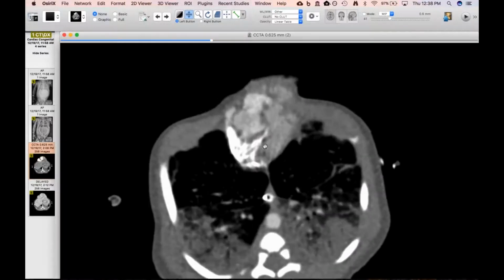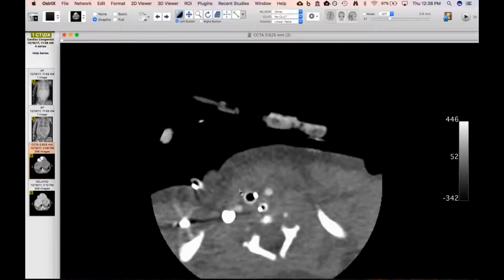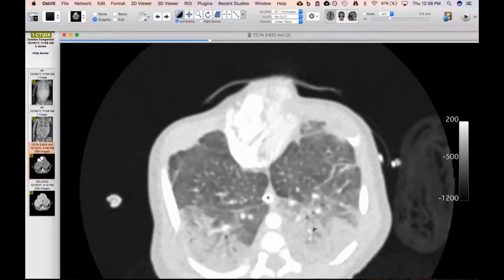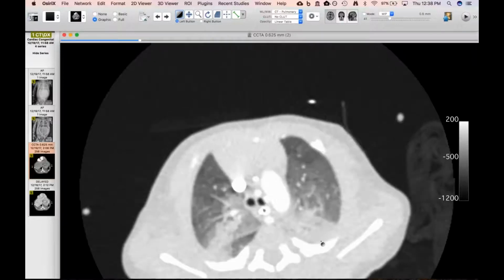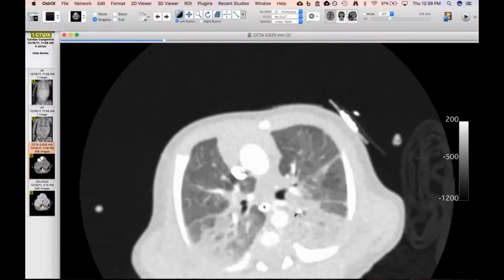So, were there any other anomalies outside the chest? The omphalocele, I don't know, and I actually looked. The airway branching pattern was normal. This is just shortly after birth, so I don't know if some of this is aspiration. We don't see many day zero CTs of lungs.